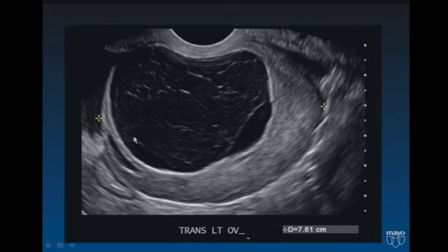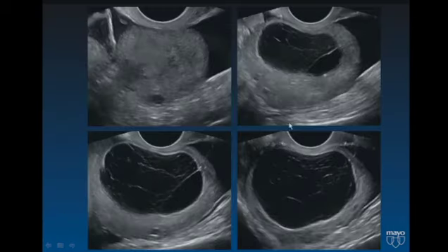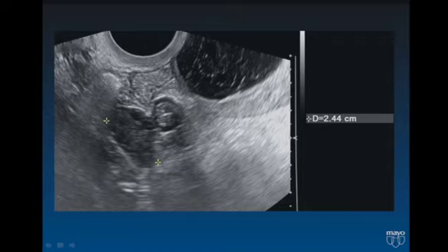And the reason I know that is because typically when we have a hemorrhagic cyst that's that large in the ovary, the ovarian stroma draped around the hemorrhagic cyst is thin. But in this case, it's not thin. It's actually much thicker than we'd expect, and it's a little smudgy. And if we look carefully at that, you'll see that there are some follicles in that tissue that have been pushed to the edge. So we need to worry about torsion that's been incited by this large hemorrhagic cyst.